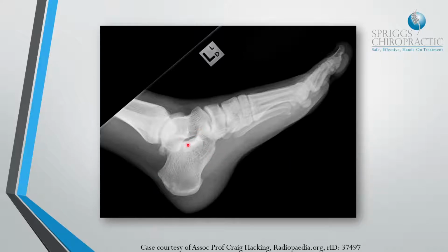The anterior aspect of the calcaneus you can see on the standard dorsiplantar projection is just here, and then we've got the head of the navicular just here. This is obviously the body with the dome of the navicular just here, and then you've got the talus, the head of the talus, dome of the talus just here. Here's the navicular. Sorry guys, I'm getting ahead of myself just there. So there's the calcaneus for you, and then you've got the head of the talus, just so that I can prove that I actually do know my anatomy. There is the talus just there. Then we've got the navicular.